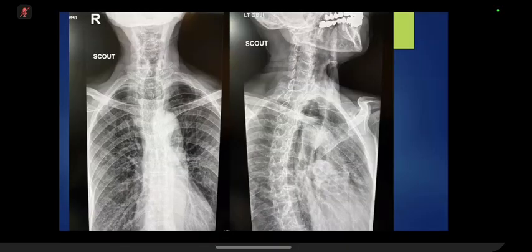So this is the frontal and lateral plane radiograph of an adult male patient, in which I can see that there is a paraesophageal elongated structure, which could represent a dilated esophagus. You talking about this? It can be unfolding of the aorta, or it can be this one.